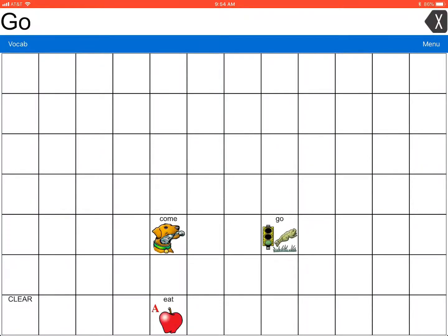Go. This teaches the student that the motor plan will remain the same even when you're teaching these skills, because the whole point of LAMP is motor planning. So they'll just learn the motor plan with less distractions with the other symbols not available to them.